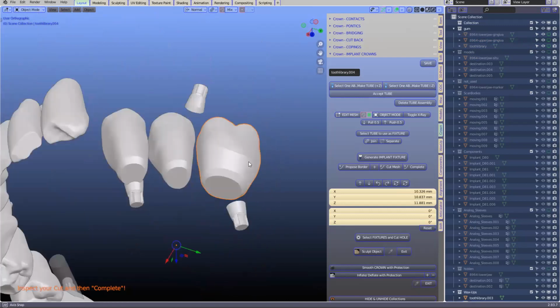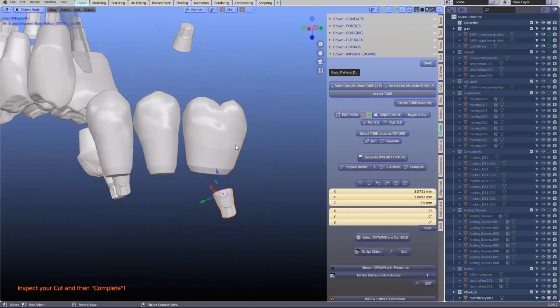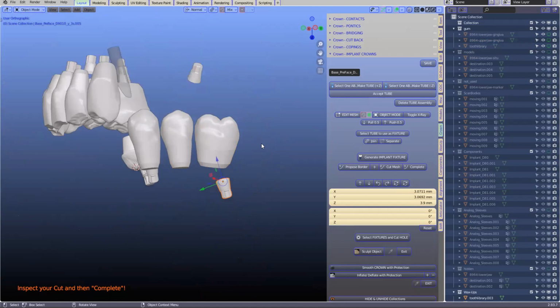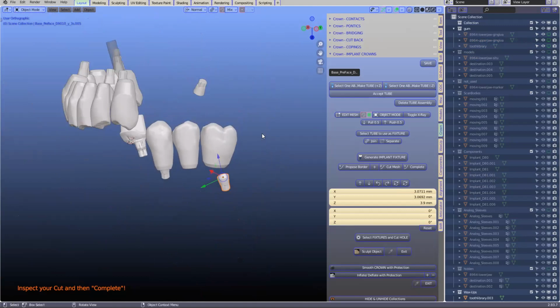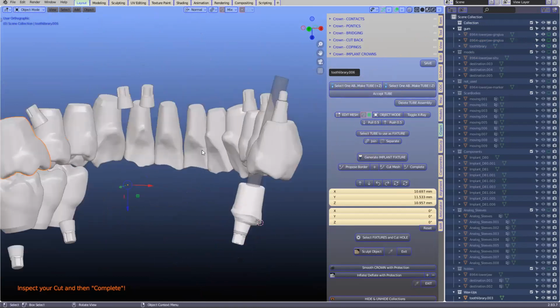Okay, so here's a bridge. Let's do the same thing with the bridge. First thing, I would suggest doing them singly, like a bridge or single. Don't do it all in one, because what has happened during my working today is that one of the opposite ones has interfered.